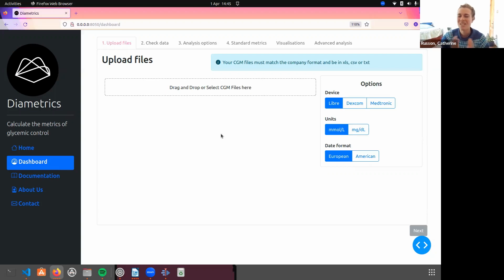Okay, so you've made it through to the last final stage of the Diametrics web app. Congratulations if you've made it this far. This is the part of the web app that really sets this application apart from other tools available for calculating the metrics of glycemic control, because you can't do it on other platforms. So yeah, basically this is the most exciting part, in my opinion.